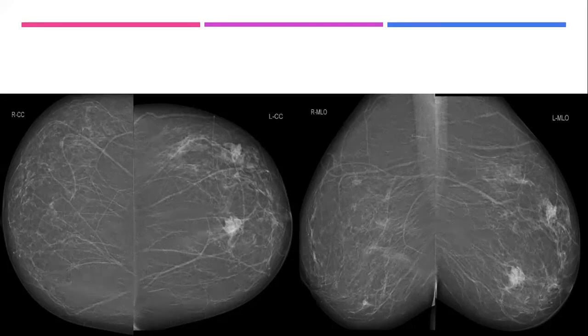Usually we classify the lesion by the more suspicious or more malignant features. Which one has more positive predictive value, the irregular shape or the indistinct margin? The indistinct. Yes. Because if I say these are indistinct, then it will be BI-RADS 4B.